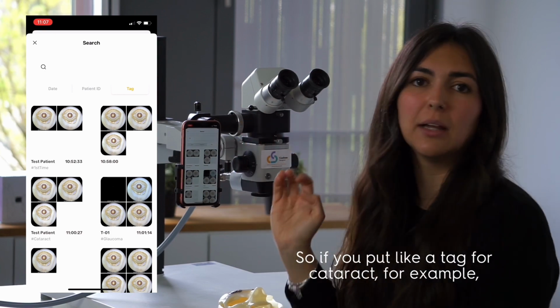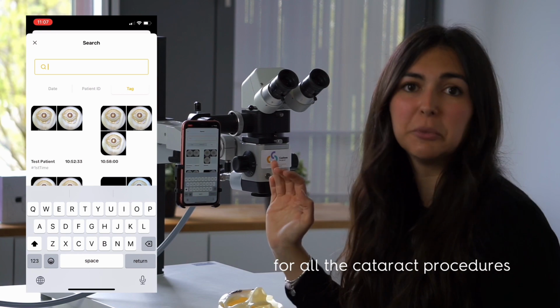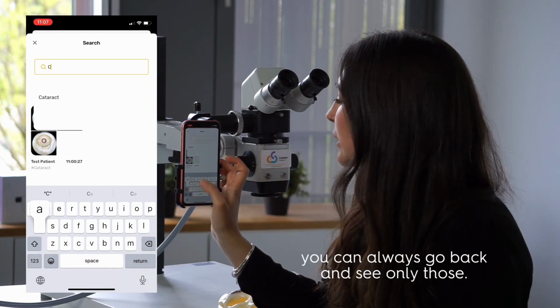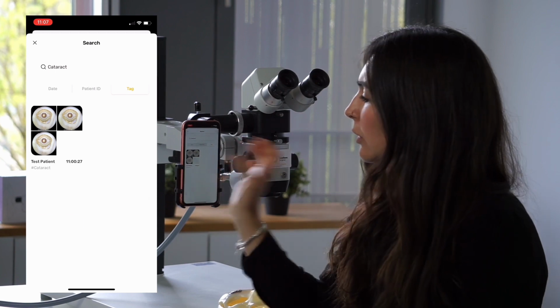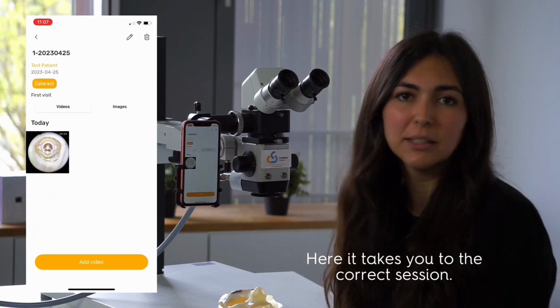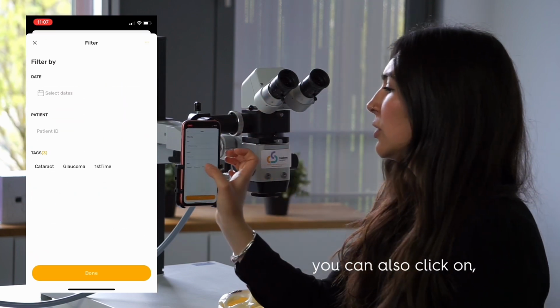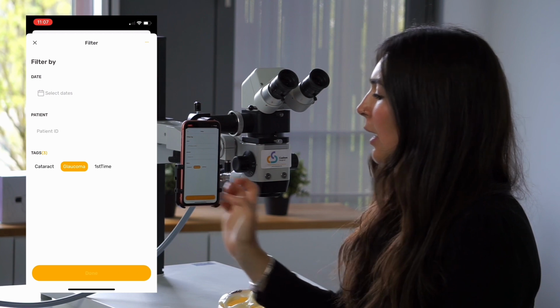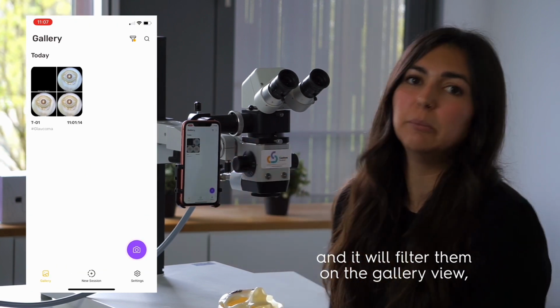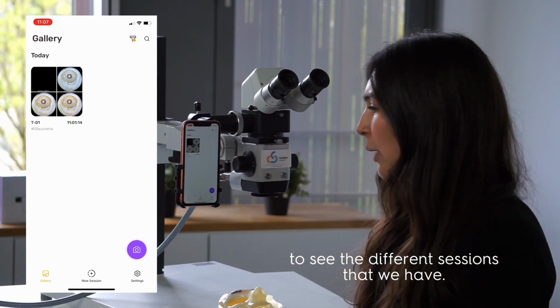And you can also filter by tag. So if you put like a tag for cataract, for example, and you want to search for all the cataract procedures you have done, you can always go back and see only those. So if you click here, it takes you to the correct session. Filtering works pretty similar. You can also click on, for example, the tag, patient ID, or selecting the dates, and it will filter them on the gallery view. So it might be easier to see the different sessions that you have.